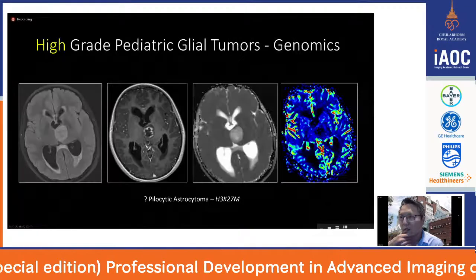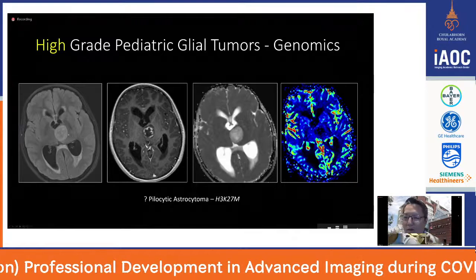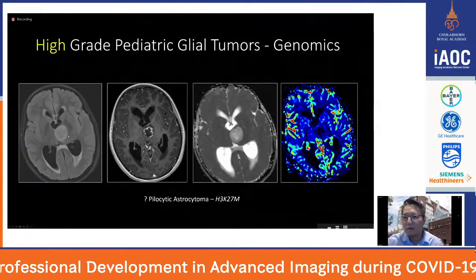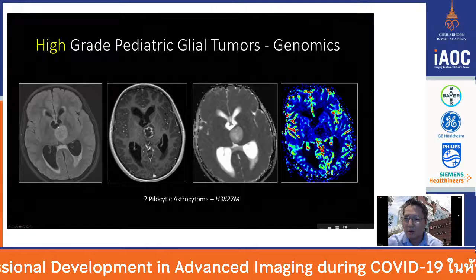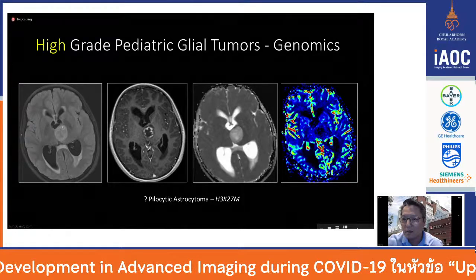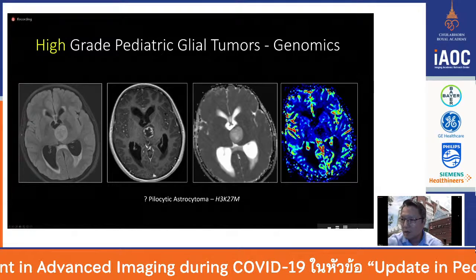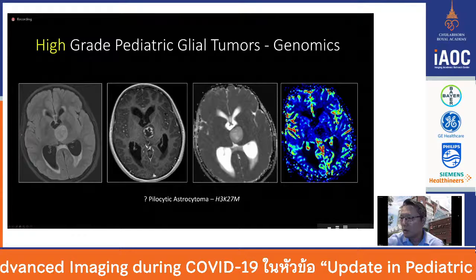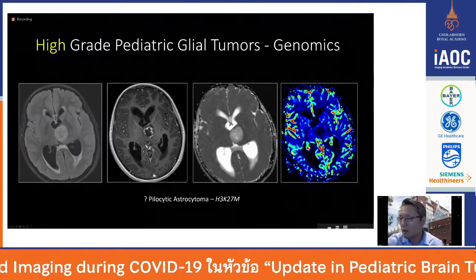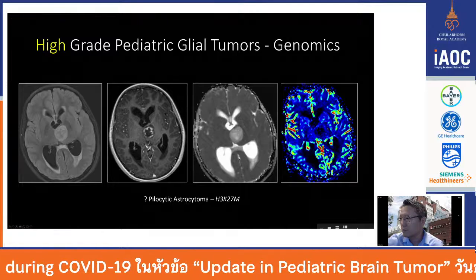Here's another case that we had in the thalamus. Again, the left thalamus was very popular at our institution. I don't know why. But here you can see, on FLAIR, this very well marginated T2 hyperintense mass in the thalamus causing hydrocephalus. There is a little bit of enhancement here, almost like the centrally necrotic pattern. But when you look at the ADC, again, it's facilitated. So there's no way we'd be thinking about high-grade tumor, and perfusion's pretty low actually.